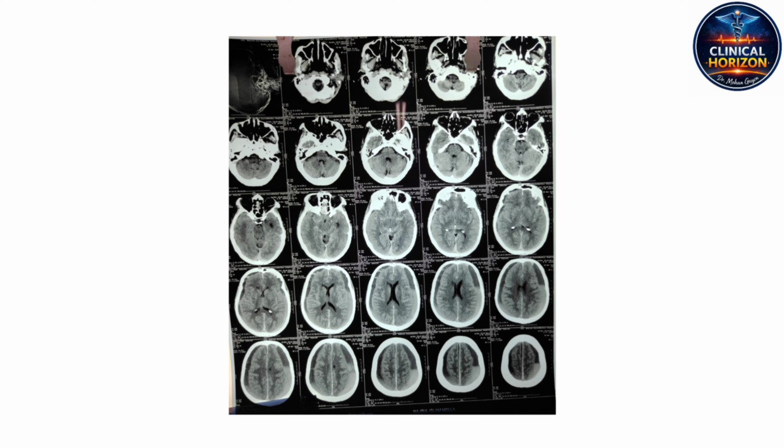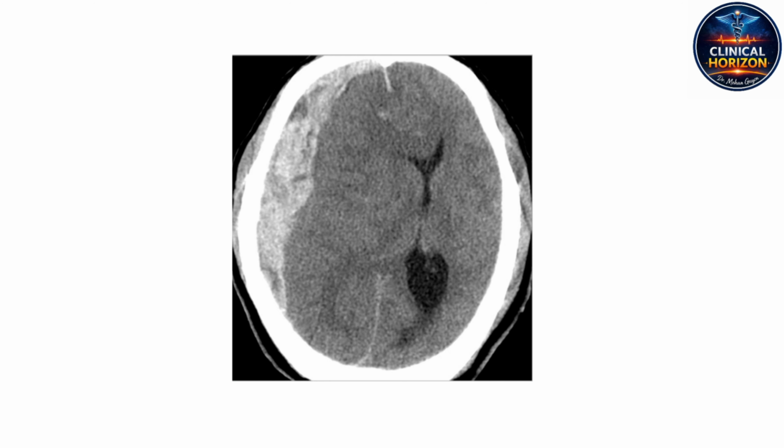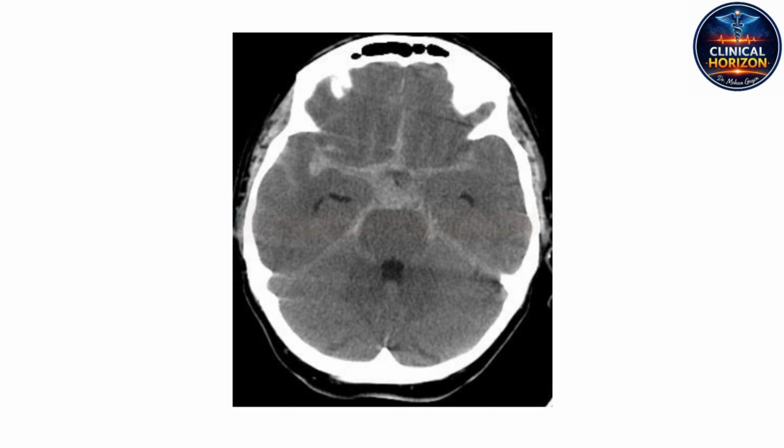Right. The underlying cerebral hemispheres are subjected to an insidious slow-motion compression that can easily mimic dementia or a slow cognitive decline if the imaging isn't scrutinized. That slow creeping compression is a fascinating contrast to the explosive nature of our next case, scan 9. A classic. We are dropping down to the base of the brain, specifically evaluating the basal cisterns. Normally, these spaces are radiolucent, filled with dark cerebrospinal fluid. But not here. No, in this demonstration, the cisterns are entirely engorged with hyperdense blood.